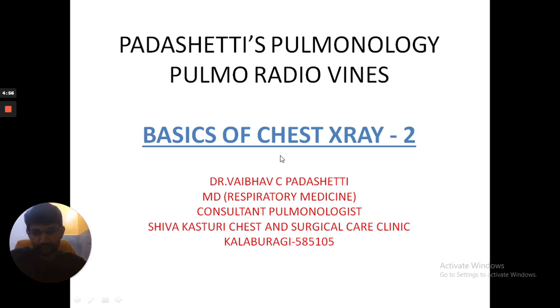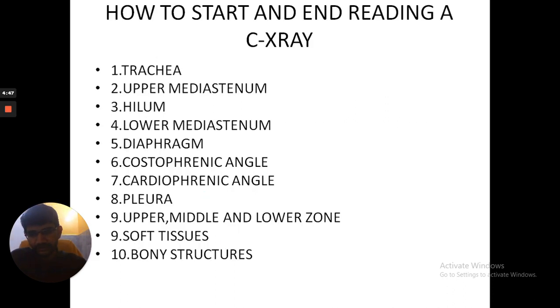Today is basics of chest X-ray part 2. We had done the basics of chest X-ray part 1 last time. So before seeing this video, please have a look at that video. It is important. Okay, coming to part 2, here we will study how to begin and end reading of a chest X-ray. These are the 10 basic points which we will go through.